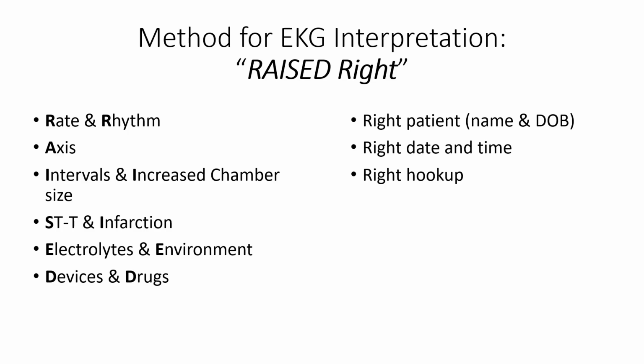You want to check every EKG. In a moment, we'll look at what can happen with an incorrect hookup. And then we need to check the speed. Make sure that somebody didn't mess around with the recording speed and that we're recording at 25 millimeters per second.